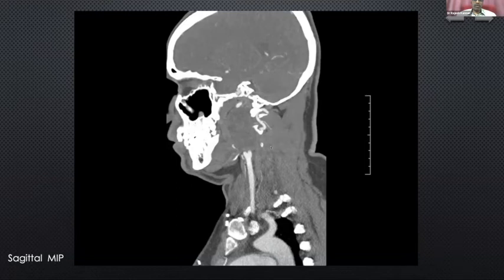Will a non-enhancing lesion always rule out an aneurysm? No, sir. Even if it is a thrombosed aneurysm, you have to look for a small focal outpouching. Many times only a neck may be seen and the entire aneurysm may be completely thrombosed. But here we are not seeing any type of neck, so you have to always look very carefully. Also, if it is a thrombosed aneurysm, generally it will be hyperdense on a plain scan. Here it is not hyperdense, so it is not an acute thrombosed aneurysm.